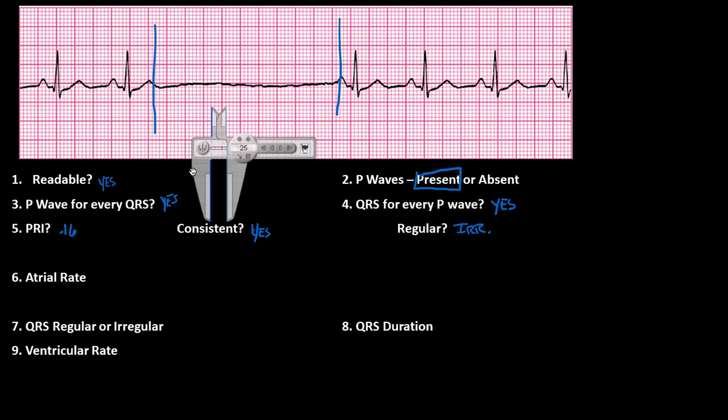And when we ask, is this regularly irregular, irregularly irregular, or occasionally irregular, based off of the EKG that we have right now, it's going to be variable in a sinus arrest, because it could be regular or it could be irregularly irregular. And it could also be occasionally irregular. It just depends. So right now, because we only have this EKG, this is occasionally irregular. So it's occurring every now and then.